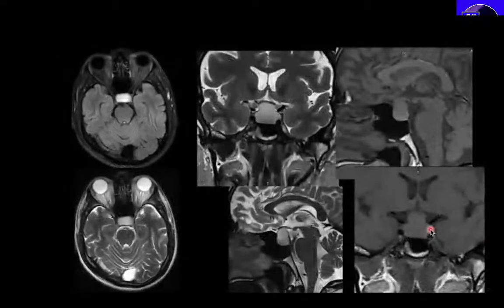Here we have another patient, a 43-year-old with a sudden onset headache and decreased vision. So we see a sellar suprasellar mass which is hyperintense on T2 weighted images, and note that even on T1 weighted images it is mildly hyperintense. On FLAIR also it is hyperintense, and we can see a slight fluid level on T2 weighted and FLAIR images. I hope you can appreciate it. So this is a patient with a macroadenoma with pituitary apoplexy.